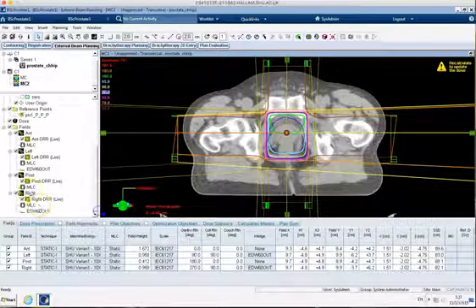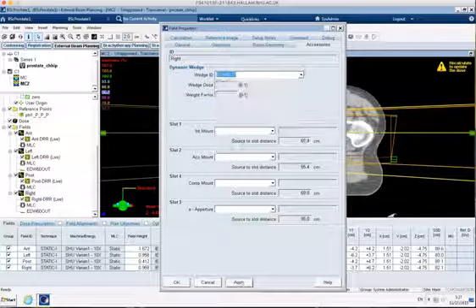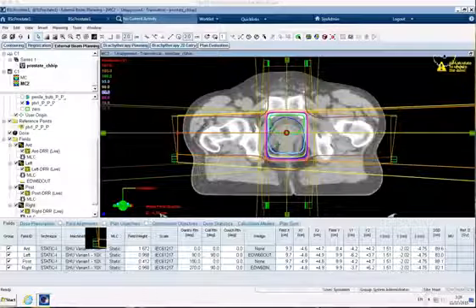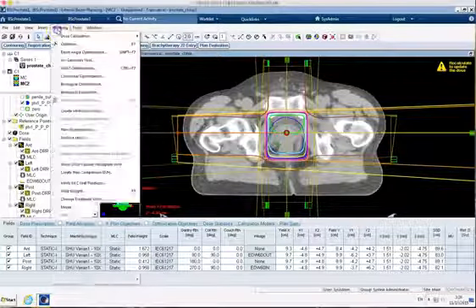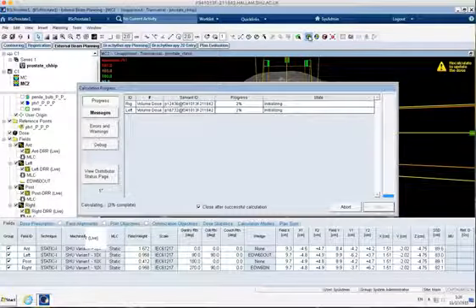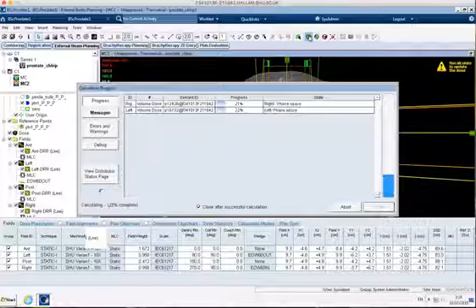So what I'm going to have to do is go back in, properties, and it's an in that I want there. Now you can see, now we've changed things, that this has appeared in this top brown corner. This tells me we need to recalculate. So I'm going to, again, you can click F5 if you want, or select that tab there, should I say, sorry. And you'll see it only recalculates the fields that we've actually changed.